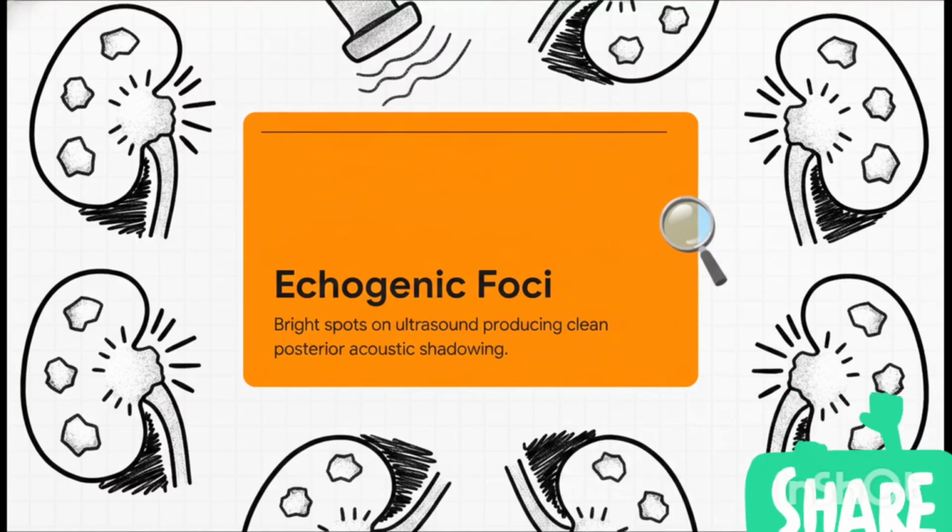On an ultrasound, stones appear as echogenic foci. I know, that's a bit of medical jargon, but essentially, echogenic just means it reflects sound waves very strongly. Because stones are hard, dense objects, the sound waves bounce right off them, making them appear as intense, bright spots on the screen. And because the sound waves can't pass through that dense stone, they leave a dark trail right behind it. We call this clean posterior acoustic shadowing. It literally casts a shadow on the ultrasound image.